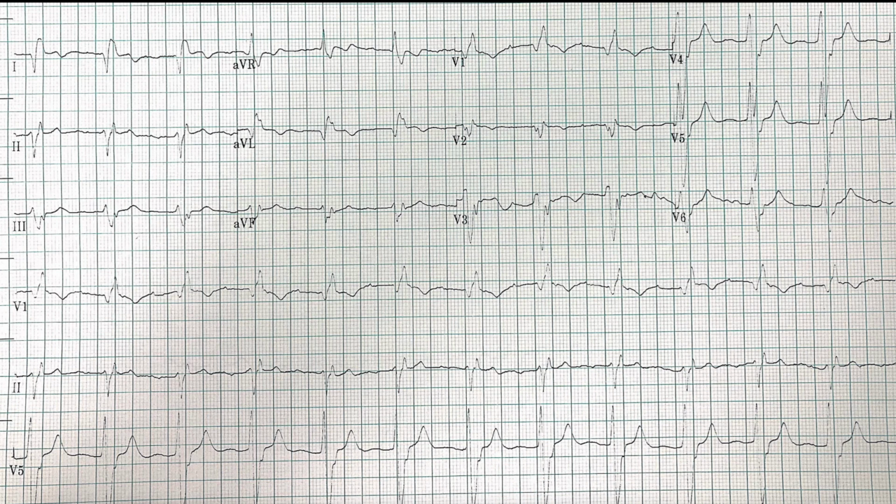that shouldn't really happen. So we've got a rate of about 72. Rhythm looks to be sinus. Our axis ends up in that no man's land, extreme axis deviation. Something seems funny. Now, it's not that it couldn't happen, but it's pretty atypical for it to happen in a living human being. Rate, rhythm, axis. How about the intervals? Let's run through those real quick.